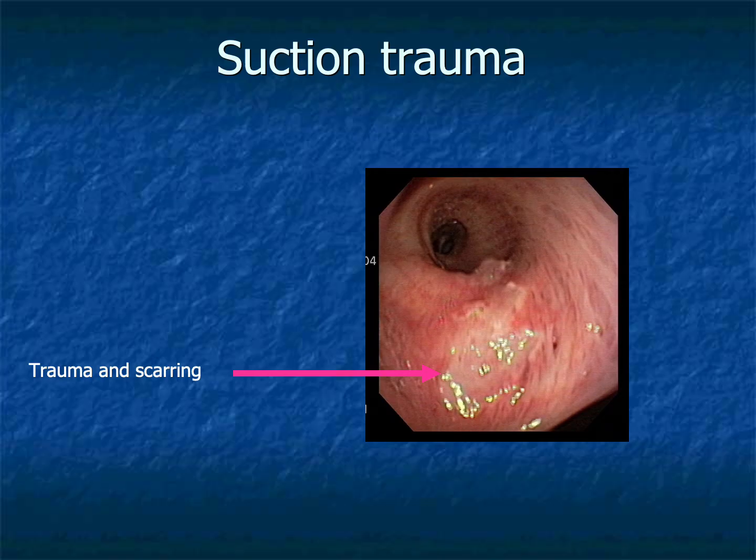Prior injury may leave permanent evidence within the airway. Scarring, distortion, and focal narrowing may result from previous infection, mechanical trauma, surgical intervention, radiation, or inflammatory disease. The bronchoscopist should assess whether scarring is stable or contributing to clinically significant obstruction.